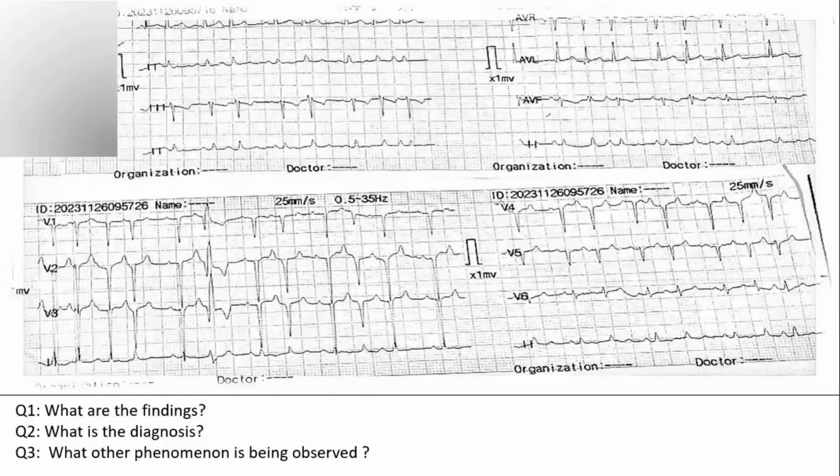Okay, Ashman phenomenon. I think this is one of the favorite questions for cardiologists. Probably they like such things when there is a kind of confusion between two things. So it's kind of an interventricular conduction delay that happens because of the changing preceding RR interval, as per my understanding. Okay, that's very good. I'll give you now details of what this is.